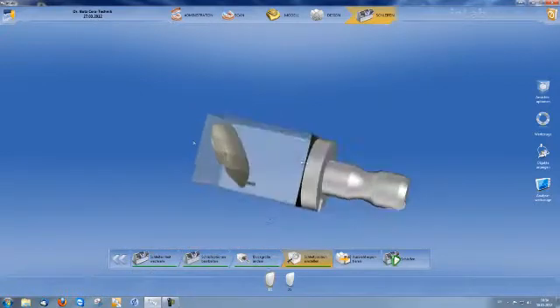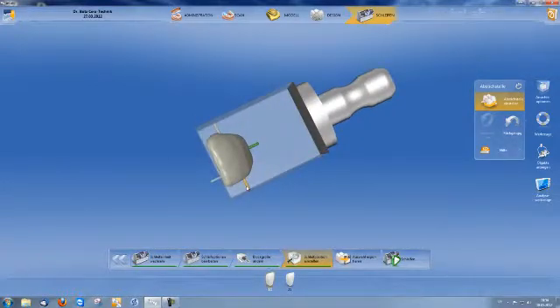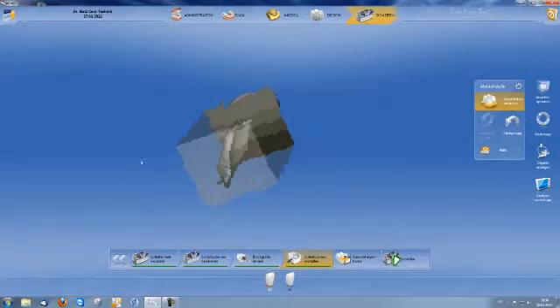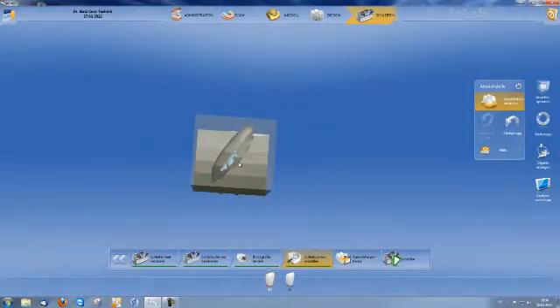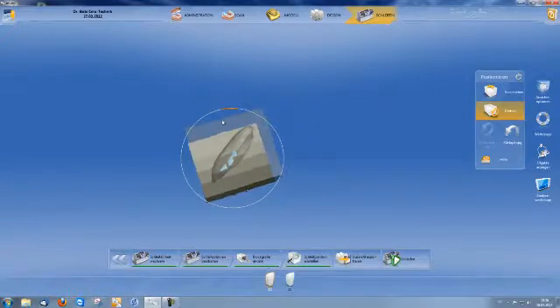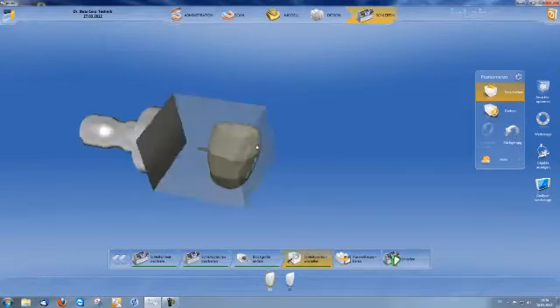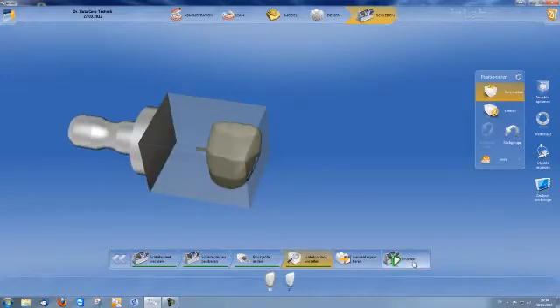I can now position the restoration in the polychromatic block. If I place the sprue location mesially, I can rotate the veneer in the block via block rotate position in order to change the various shades of my restoration, and via position, I can render the veneer either more translucent or more opaque. In the final step, I give the mill command and can mill my veneer.